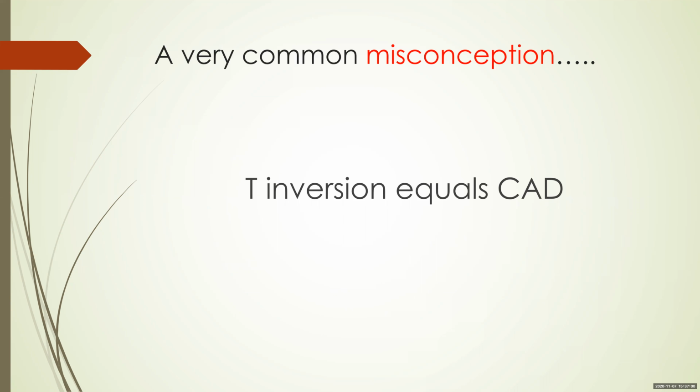So a very common misconception: T wave inversion equals CAD. I've seen untold numbers of referrals to a cardiology center saying that this patient has T wave inversion and he was started on antiplatelets and statins. So a very common misconception is T wave inversions equal CAD. I shall try to prove this wrong during the course of this video. So let's have a look at it.